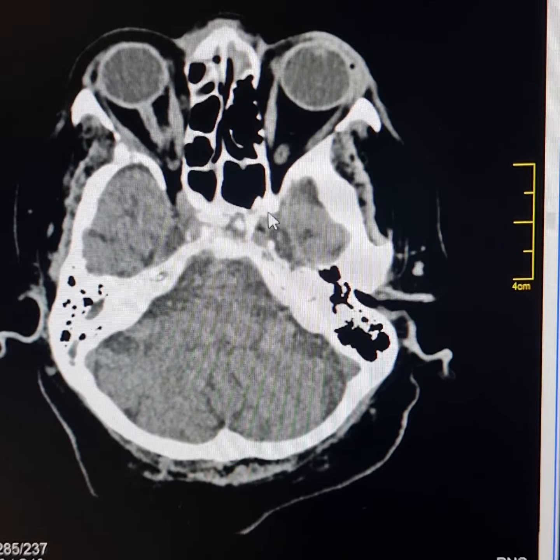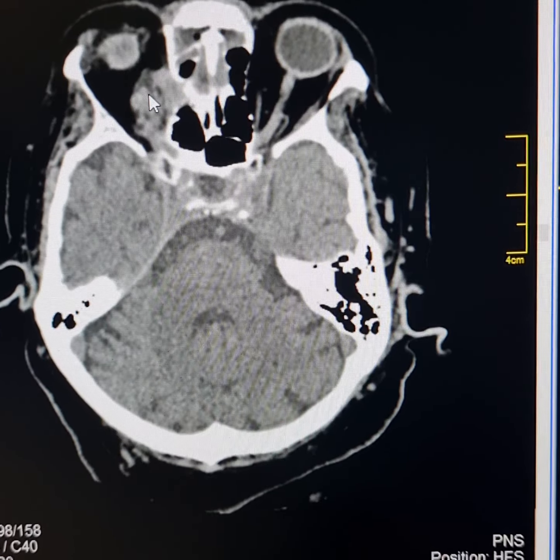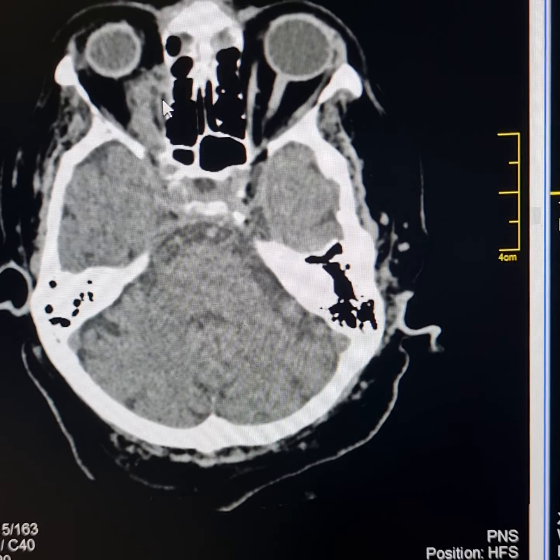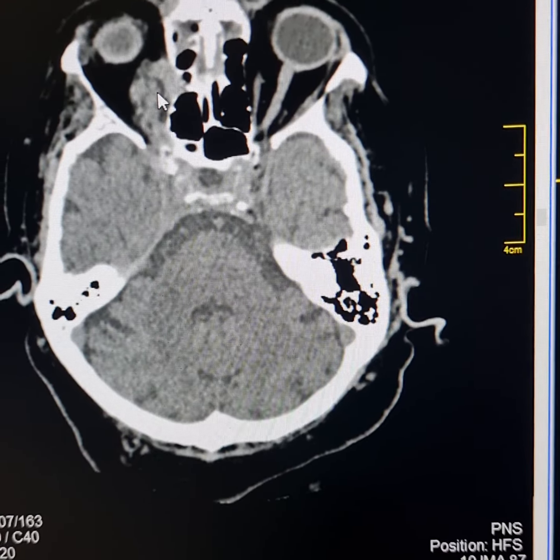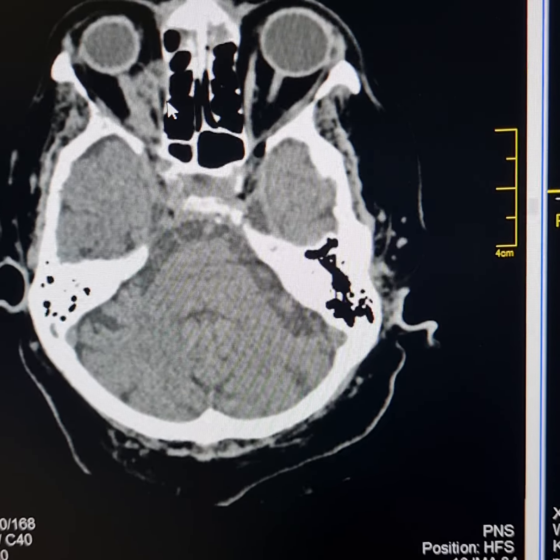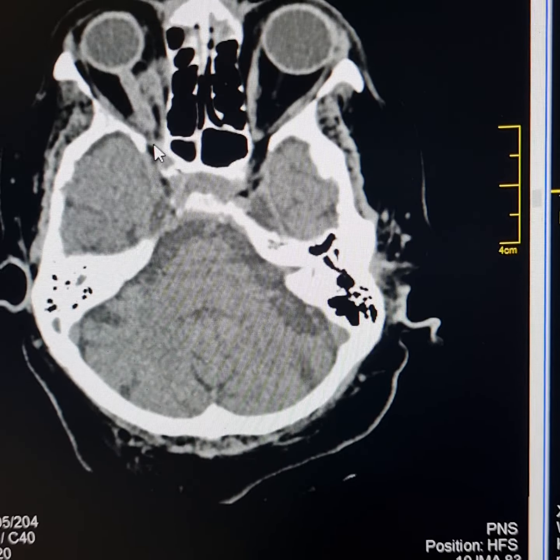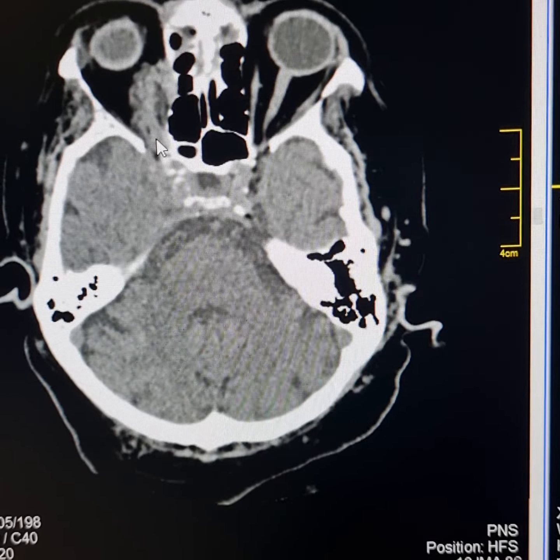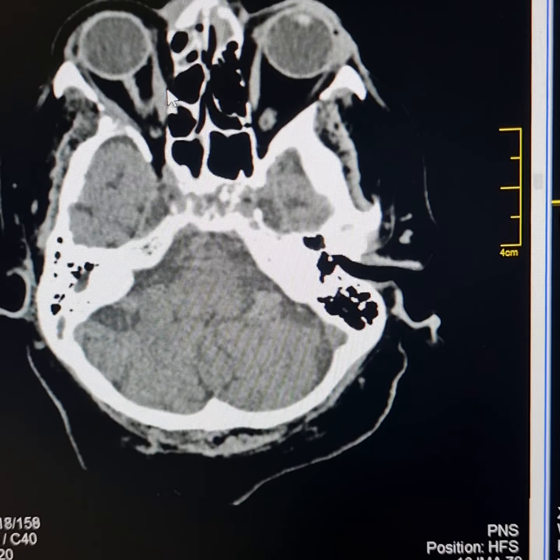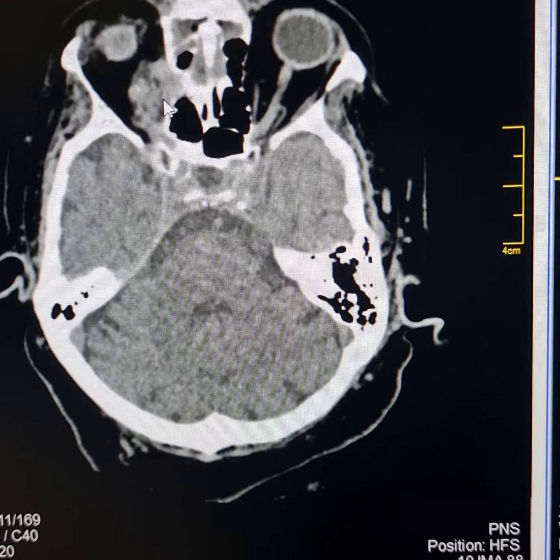Patient has developed ptosis on right side. Now please observe, this is a soft tissue mass which lies in the superomedial part of right orbit. This one here. Adjacent bone is normal. Lamina papyracea is intact. Posteriorly, it extends up to the orbital apex. In this region, it has partly surrounded the right optic nerve. Its interfaces with the medial rectus and superior rectus muscles are indistinct.